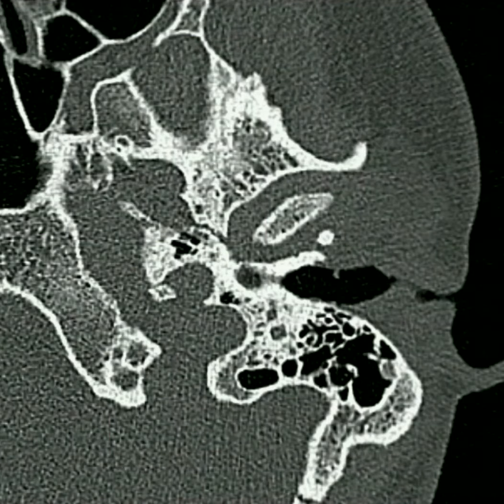Now let's identify these same structures on an axial CT through the temporal bone. The carotid canal is right here and is separated from the jugular bulb by this carotid-jugular spine. It is this structure which we should pay close attention to, as the inferior tympanic canaliculus will arise from it as we scroll a little more superiorly.